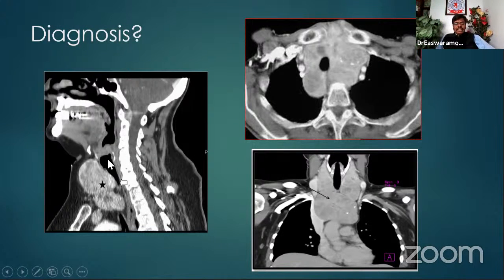So if you carefully see, it is a trachea. In front of the trachea, there is a large thyroid swelling encircling the trachea and going behind the sternum. As you can clearly see in the coronal section, you can see the proximity of this lesion to the great vessel, isn't it? So it's a retrosternal extension, a retrosternal goiter. So what is the sign you elicit in a retrosternal goiter? For undergraduates, when you do this, there is engorgement of veins in the neck. What is that sign, Karthikeyan? Pemberton sign, isn't it? Yes, sir. That's right.